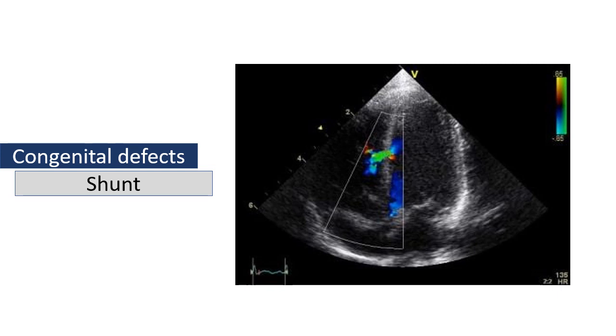If the patient is ischemic and the septum is severely thinned out due to myocardial infarction, it then gets ruptured. So ventricular septal rupture may occur due to ischemia or may be congenital, and this is an example for shunting that can be diagnosed by color Doppler and maybe also by continuous wave Doppler.